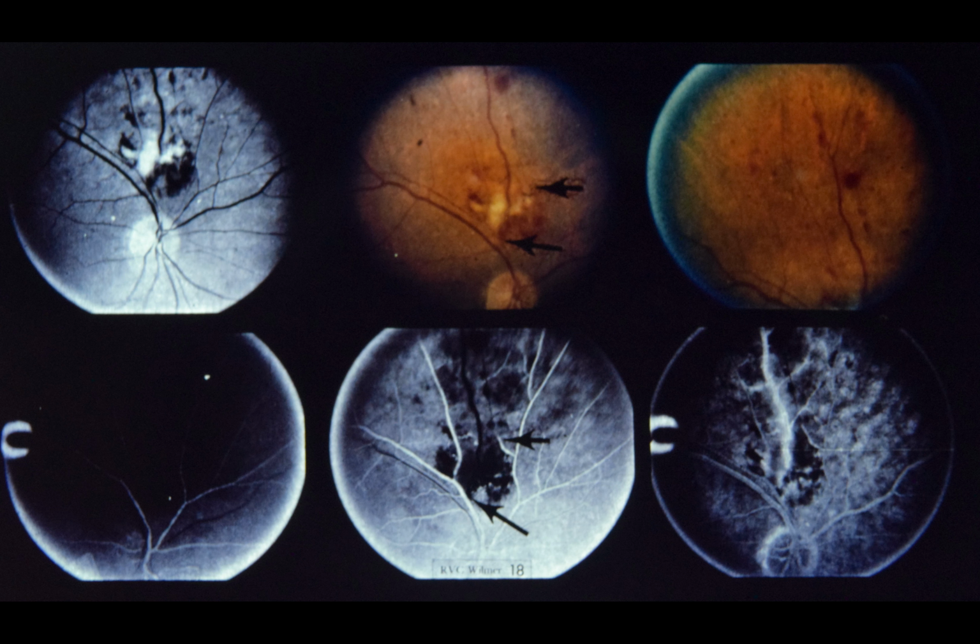It is possible that the patient illustrated in this slide may have initially had a pure venous obstruction and developed retinal artery obliteration subsequently. Since she did not have macular edema or neovascularization, no treatment was recommended. In the next section, we focus our attention on the subject of diabetic retinopathy.